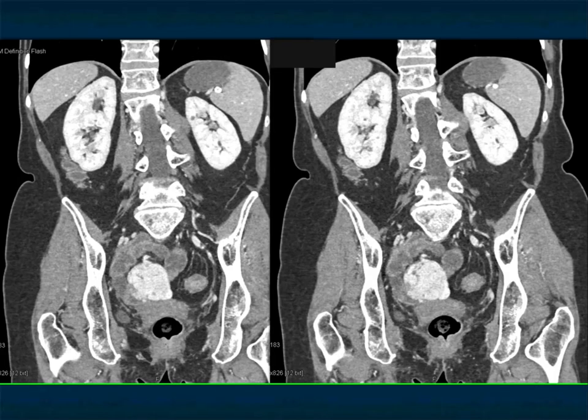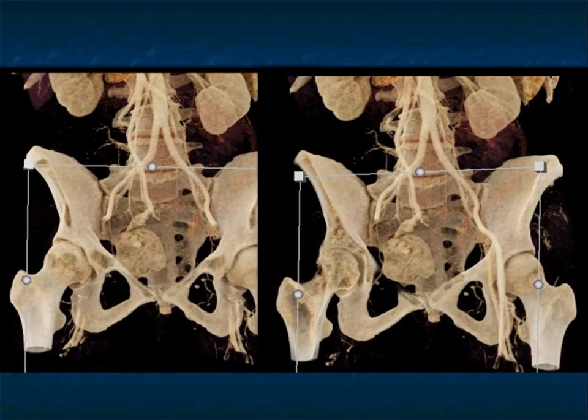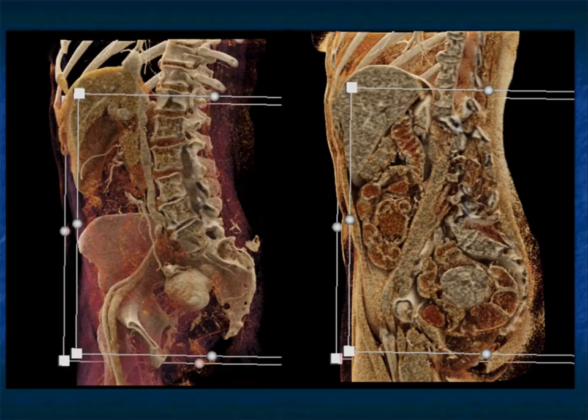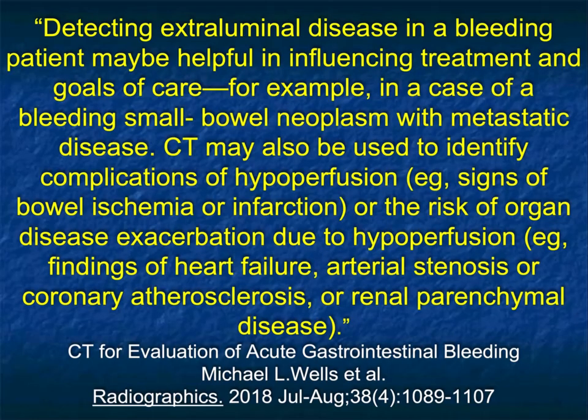And here again is the vascularity of the lesion. Here it is nicely shown with cinematic rendering. And again, just showing you the feeding vessels, the large mass, and the vascularity. Just a really nice example, again, with a range of cinematic renderings.